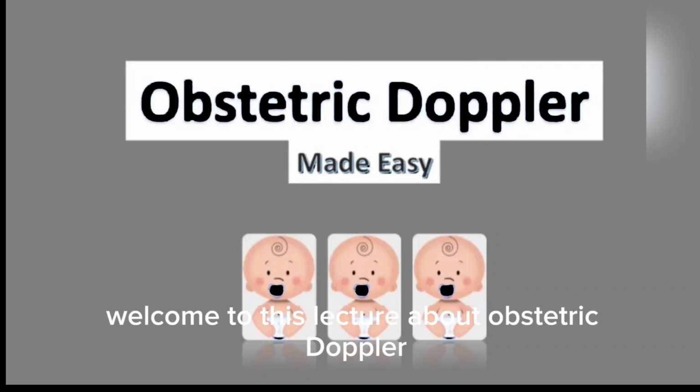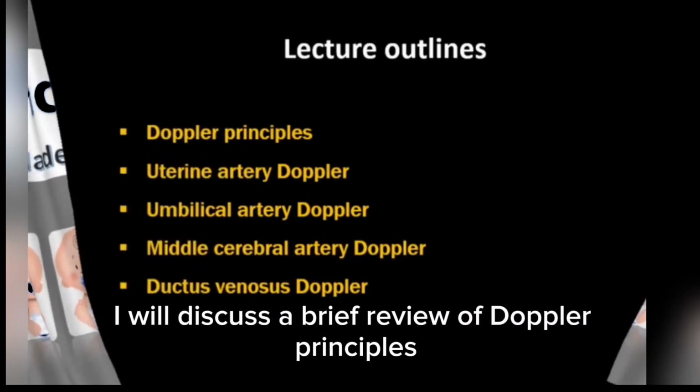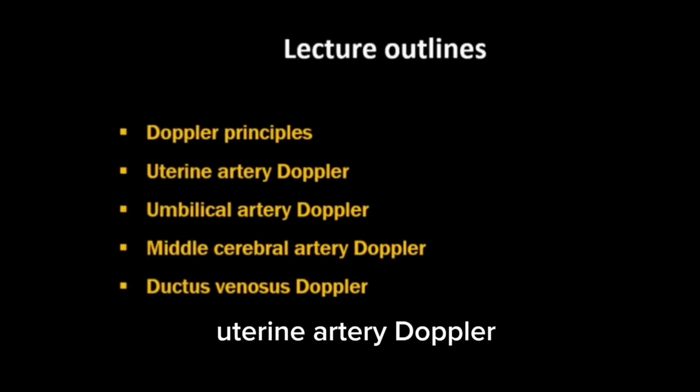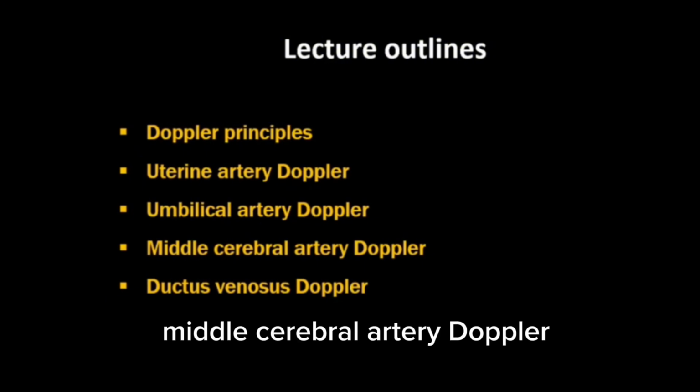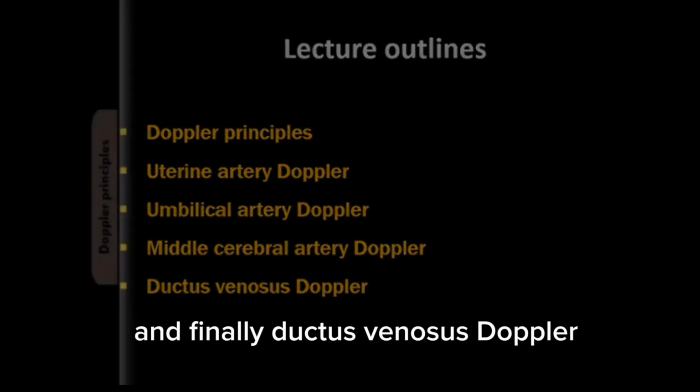Welcome to this lecture about obstetric Doppler. In this lecture, I will discuss a brief review of Doppler principles, uterine artery Doppler, umbilical artery Doppler, middle cerebral artery Doppler, and finally ductus venosus Doppler.